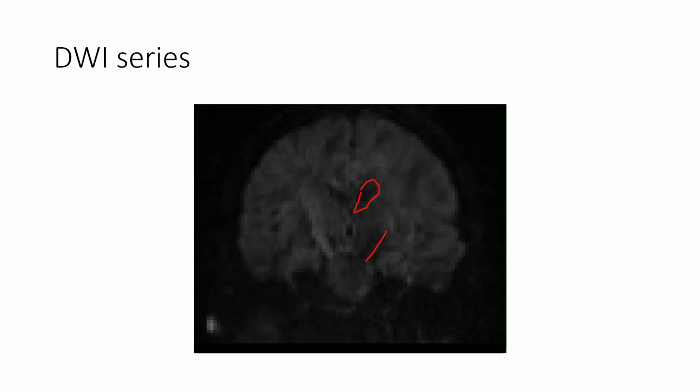And so there, again, is a video showing multiple directions. As we're going through, of course, you can see different white matter structures that can appear. We'll see corpus callosum that will appear up here. And in this slice, we can see these white matter pathways a little more clearly. And so again, a lot of directions as we go through them.